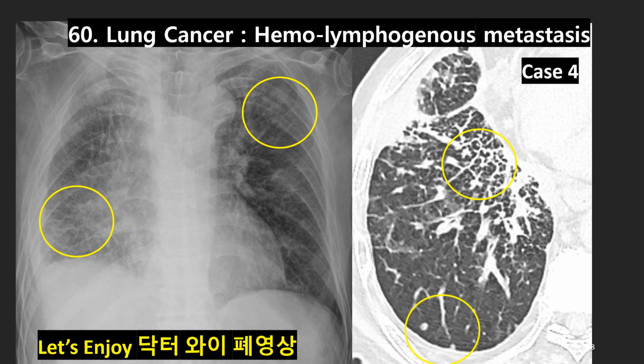On his right lung on chest radiograph, you see the reticular nodular pattern, and in his left upper lobe we see nodules and reticular nodular pattern. On thin section CT of the right lower lobe, it shows all findings: septal thickening, arcade formation, prominent central core, bronchovascular bundle thickening, and in the posterior portion, hematogenous metastatic nodules, right?